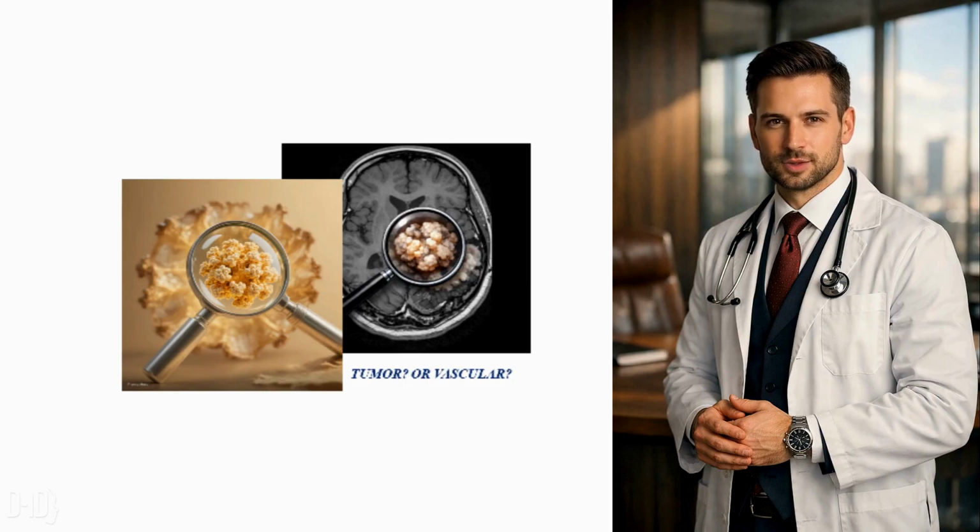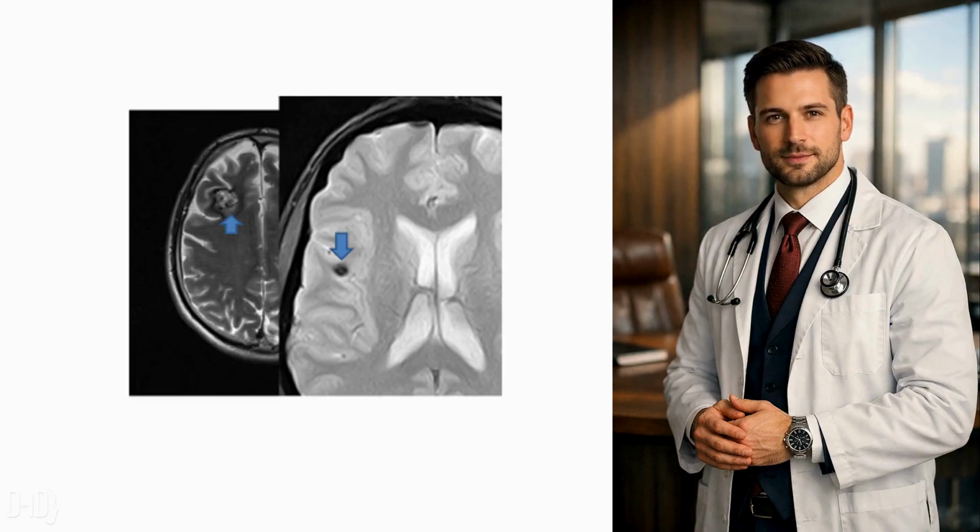But as a neuroradiologist specialist, you look closer and you see something else. A popcorn-like texture with a dark hemosiderin rim. It's not a tumor. It's a vascular trap. If you treat this like a tumor, you could make a catastrophic mistake.